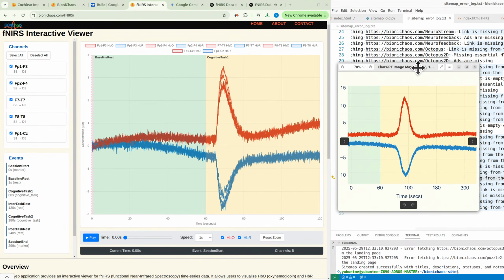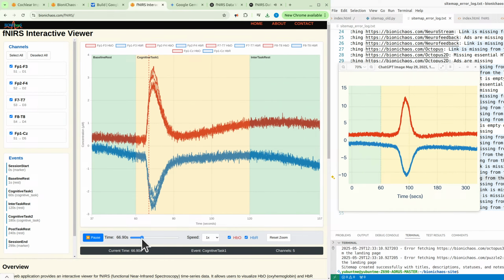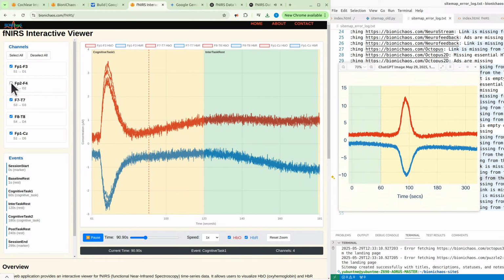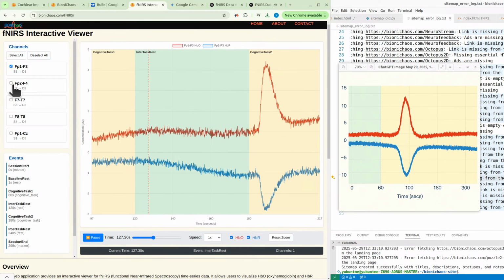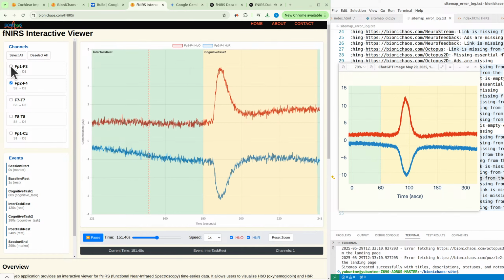It gives you control over the view. How so? Well, there's a channels section. It lists all the available channels, each with a little checkbox. So you can just uncheck the ones you don't want to see. Exactly. Want to focus only on the frontal lobe, deselect everything else. It really cleans up the plot, lets you focus. There are usually select all, deselect all buttons too, which helps.